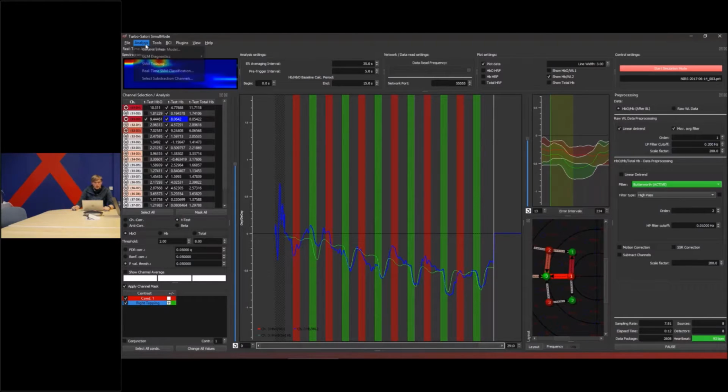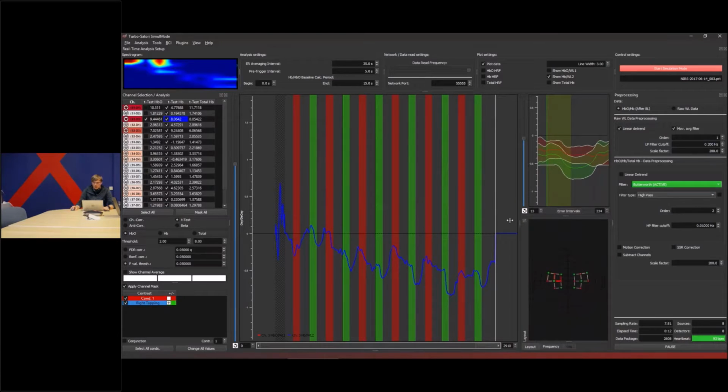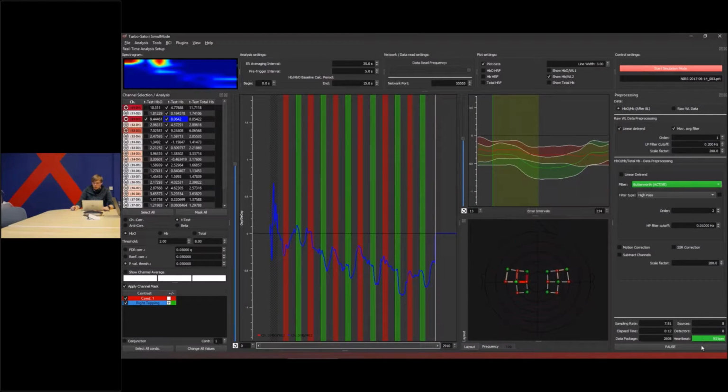Now these procedures allow you basic inspection of your statistics, of your analysis pipeline, and can be very easily used to verify that your data is properly recorded. So in summary, you have right away a heartbeat detection, which is also shown here on the side. As soon as you see a little icon, that means that your heartbeat is there. If you don't know which channel number a source detector pair is, you can just hover on top of it and then you see the channel number.